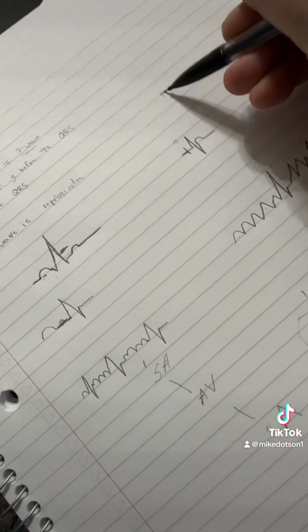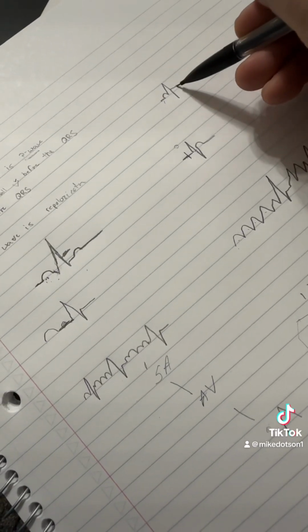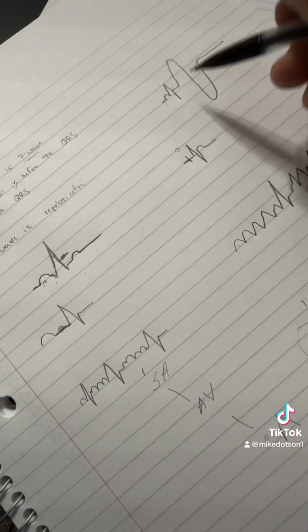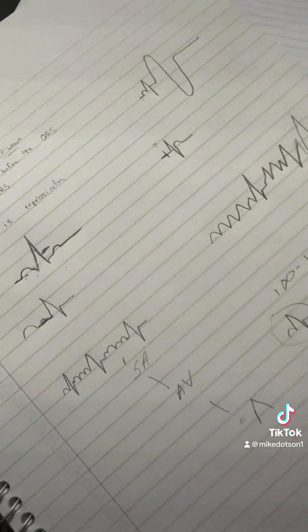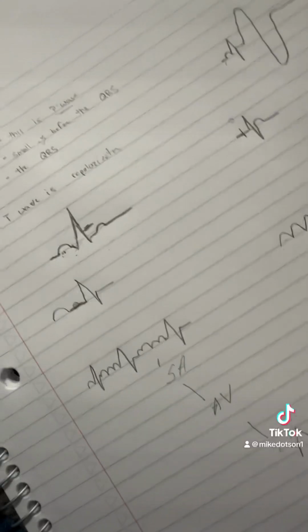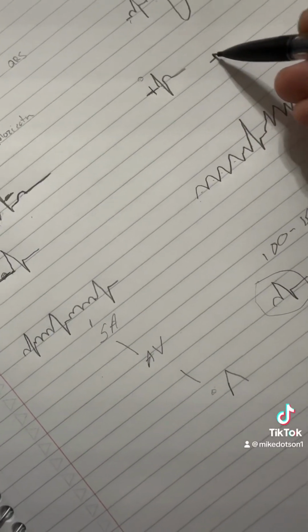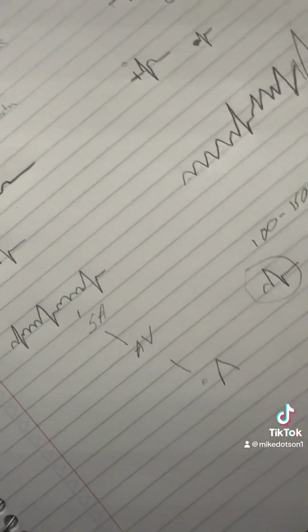PVC, there's a normal sinus rhythm right here. And then over here you'll see something huge. Big beat like that right there. Something crazy looking would be a PVC. But you can also see PJCs, which are these. It is just a random beat somewhere in between the normal sinus rhythm without that P wave there.